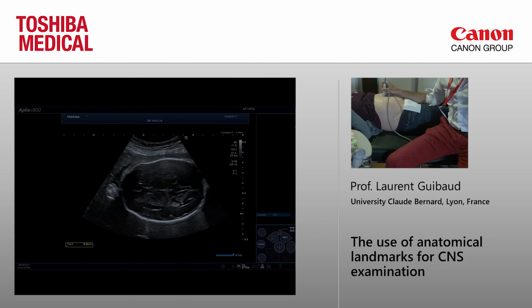Look at the pericerebral spaces. If they look enlarged, you are in the familial benign macrocephaly, which is really rare. But if they are reduced, you are in an obstruction pattern. So this is something which is very interesting to look at, but it remains subjective.